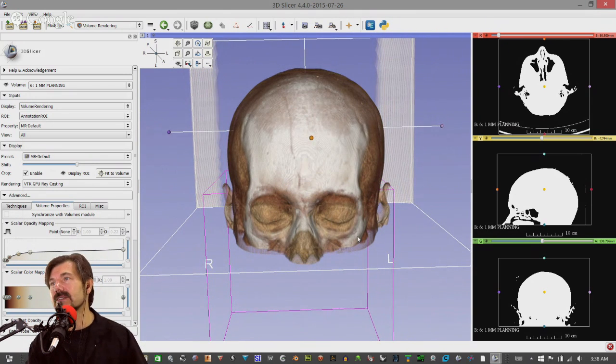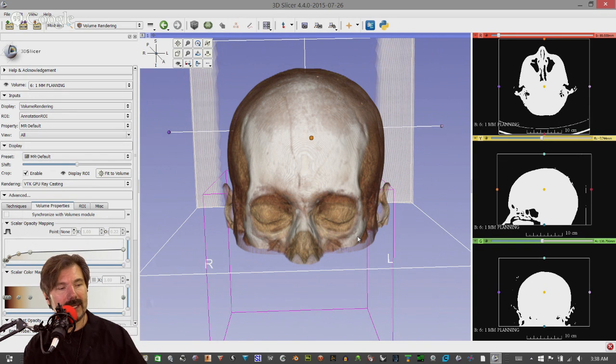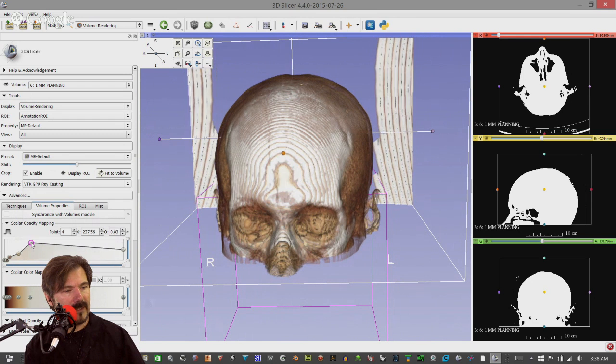And again, if you have access to some of the higher, pricier versions of this, you can do the same thing. Some of them have algorithms and one-button processes, but they're more expensive. You pay for that capability. But if you are a programmer and you know Python, you could do the same thing here. You could create your own little algorithms and buttons for something that you want to work with on a daily basis. So let's go over here and tweak these a little bit.